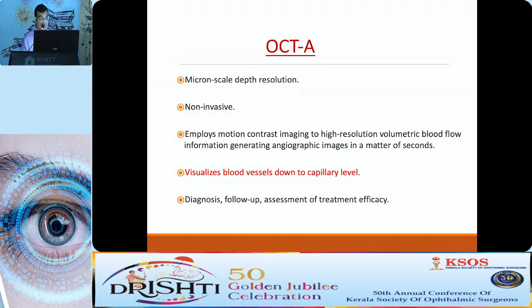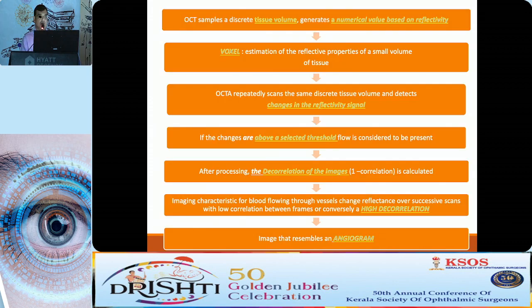It's a non-invasive modality that employs motion contrast imaging for high resolution volumetric blood flow analysis, and visualizes blood flow down to the capillary level in the choroid also. Flow which is less or more than the usual flow is difficult to visualize over it. The flow has to be within the limits that the machine can recognize, a moderate flow. Since it's non-invasive, you can diagnose, follow up, and repeat it on all visits. It's easy to use and to see the pathology on repeated screenings.